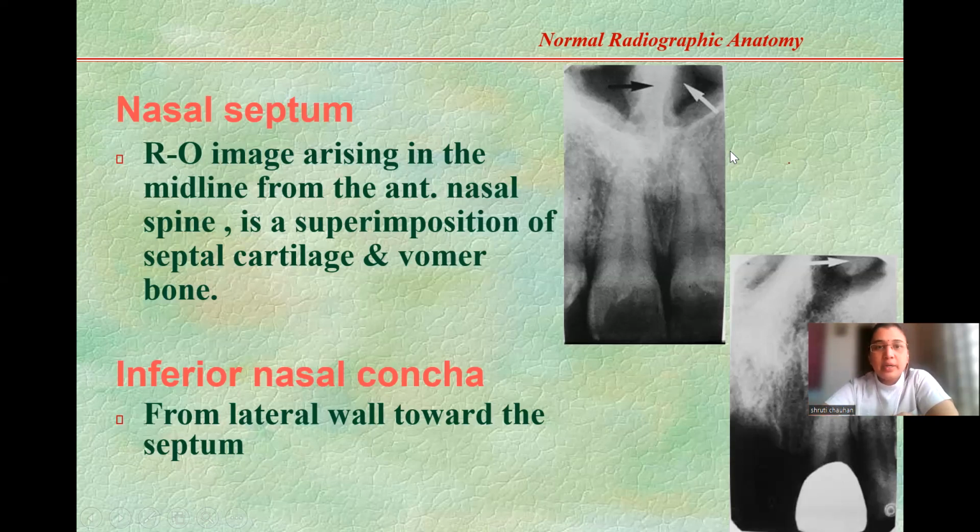So it is basically the nasopalatine foramen. Nasopalatine foramen में से हमारे जो incisive, it transmits the nasopalatine vessels and the nerve. Touch your tongue behind the roots of your central incisor, and where you have the incisive papilla, that is the incisive foramen. वहीं पे. This transmits the nasopalatine canal, or it's also called the nasopalatine foramen.